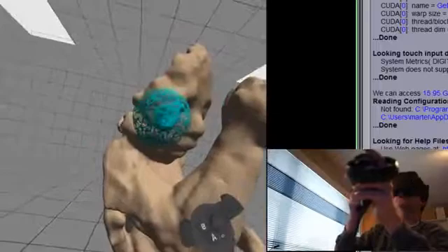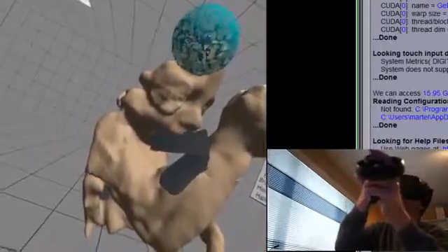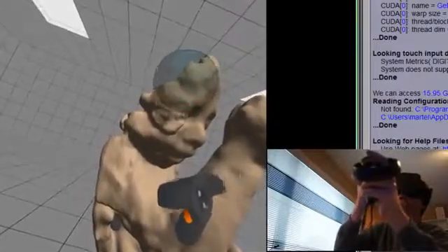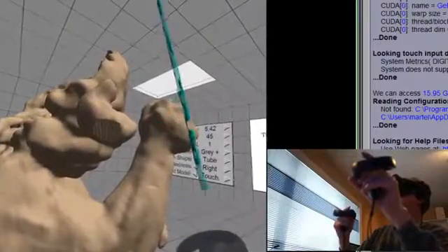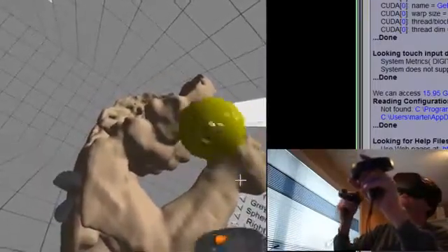Whoop, that's the wrong tool. I've got the undo. If I press the hand trigger and the index trigger at the same time, then I'm undoing what I've done. But of course I'm also bringing back something I deleted before, so I'm going to remove it.